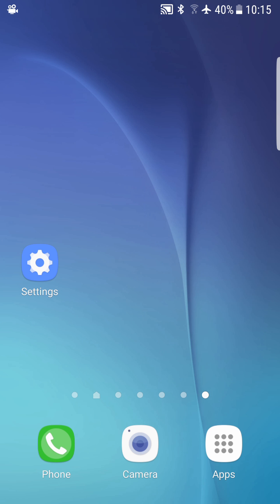Well, first, sorry for that. Let's crack the puzzle. It's a sunny Monday here, so I have plenty of time to do it. I'm equipped with an Android phone and a bioharness sensor. There's no IoTool application installed yet, and the Zephyr Bioharness sensor is not paired with a phone yet. First, we need to pair a sensor.